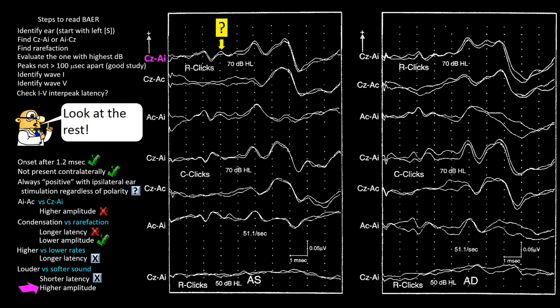This finding supports that the putative wave 1 is the real wave 1. So when everything is said and done, the score of the non-obligatory items stands 2 in support of this putative wave being the real wave 1, 2 that do not, and 2 that we cannot tell.